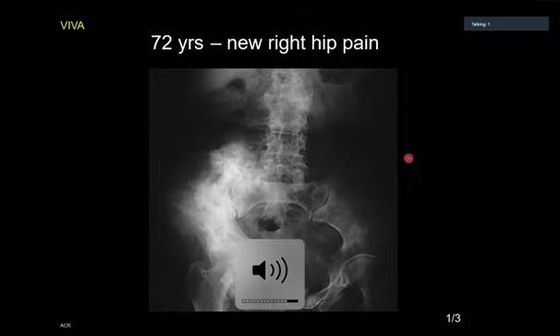Okay, so frontal radiograph. This is a known case of Paget's disease. There is diffuse aggressive periosteal reaction in the right hemipelvis, which is concerning for malignant transformation to osteosarcoma in the right pelvis. Okay, so in this particular case, what is happening here?